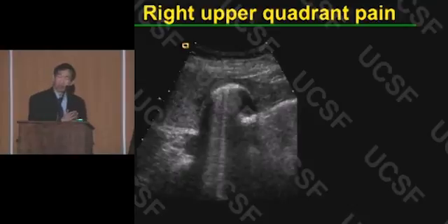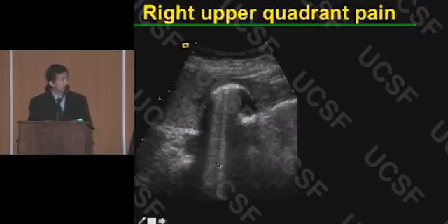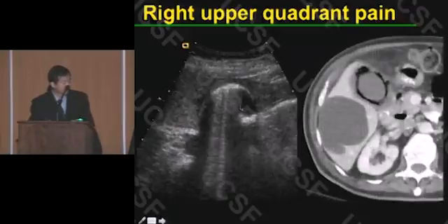This is a Röntgen classic. This is an ultrasound of the right upper quadrant. There's no Doppler on this exam, and it's important not to mistake this for a wall echo shadow complex. What we're seeing is the gallbladder behind the liver, and we can see this dirty shadowing behind some bright echogenic reflectors. What is this? This is not due to stones, which will have dark black shadowing behind it, but rather due to gas. So this is emphysematous cholecystitis.